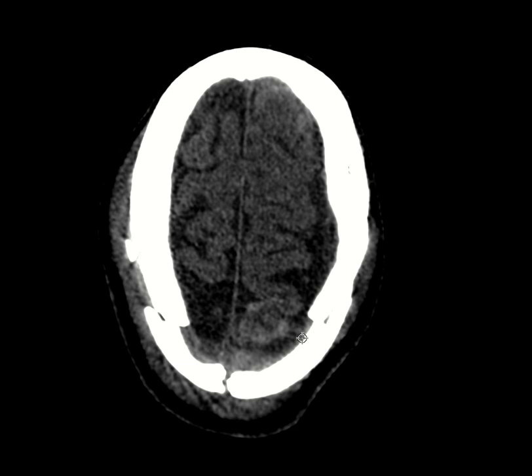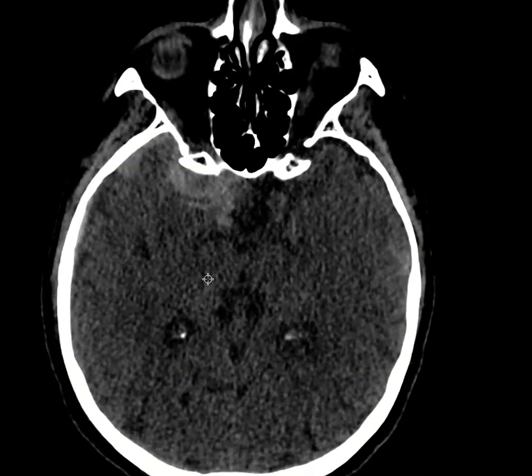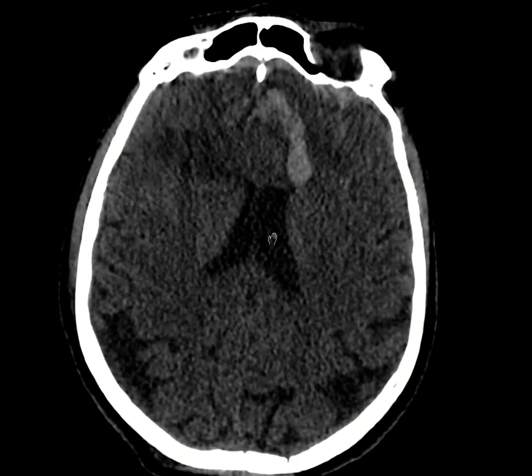And then we look for hydrocephalus. And at the end, we always need to look for fractures and what fractures do to the patient. And we also have all these soft tissue structures we need to look for. That's another topic, where we need to look at the orbit and the facial structures. But for now, I just wanted to focus on the brain parenchyma itself and the bone window for fracture.